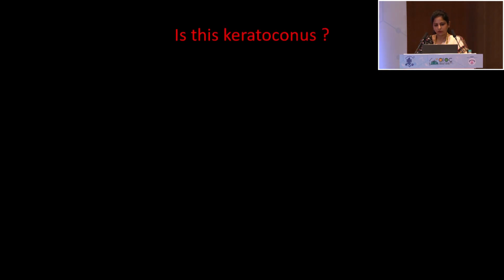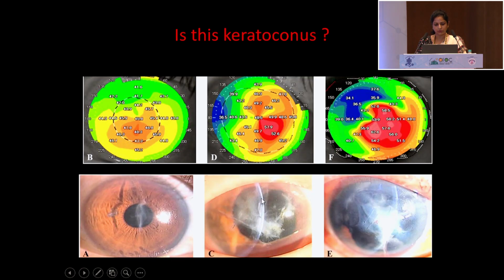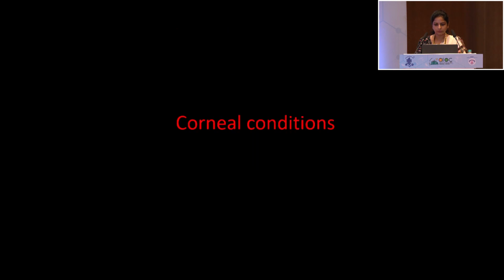So for this, I'll just take 1 minute. Here, what do you see? Do you think that these scans are of keratoconus? No, you have to correlate by clinically examining the patient. These are scar patients after corneal tear repair. So steepening can be seen in all these cases.